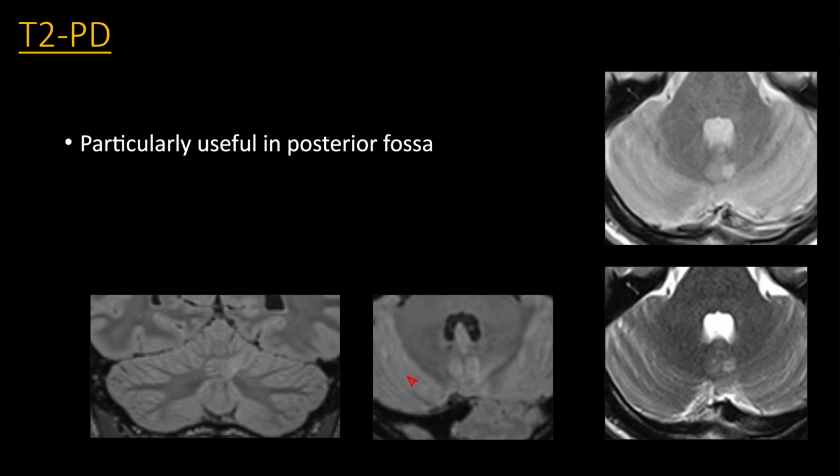Again, this is a 3D acquisition FLAIR, so if you do your MPRs in the coronal plane, you can see here this white matter. It's supposed to be dark, but it's actually a little bit bright compared to the white matter here. So you can see that there's truly a lesion here, and if you're pretty sharp, you'll be able to pick this up even on FLAIR. But really, the proton density and the T2 show it much nicer, much more convincing, and easier to pick up. This particular lesion was actually missed on prospective interpretation of this study, and I think the reason is just that nobody bothered to look at the proton density or T2.